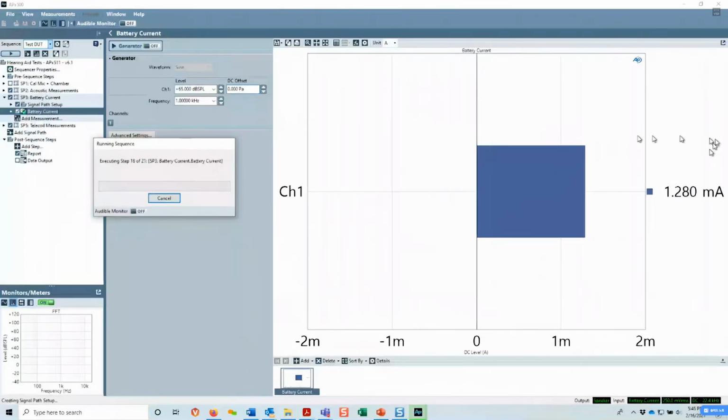With these telecoils, the loops, the position where the strength is a maximum can vary from box to box, and you're supposed to position the hearing aid at that point. In this case, I'm just going to leave it where it is. It's close enough for demonstration purposes, but I'm going to switch the hearing instrument to telecoil mode.